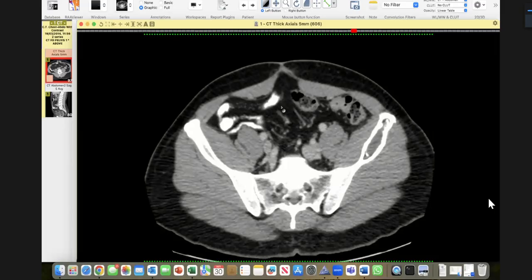So the point is that this was a slam dunk fibrous dysplasia. This was the type of case where there was an emphatic diagnosis. In these kinds of cases, the examiner will push you, asking what is your differential. So the examiner is pushing you, and to tackle it, you have to tackle it slightly differently. You have to tackle it diplomatically. Stay firm. So here, when there is an emphatic type of diagnosis, stay firm.